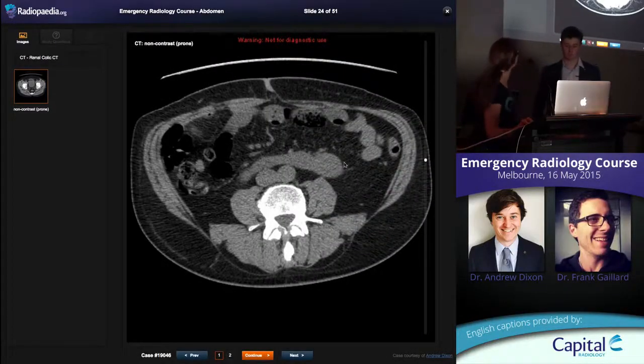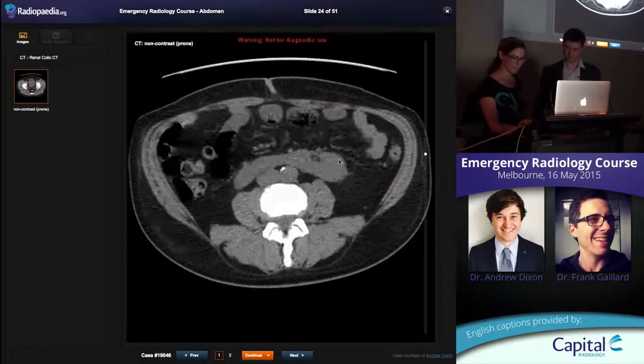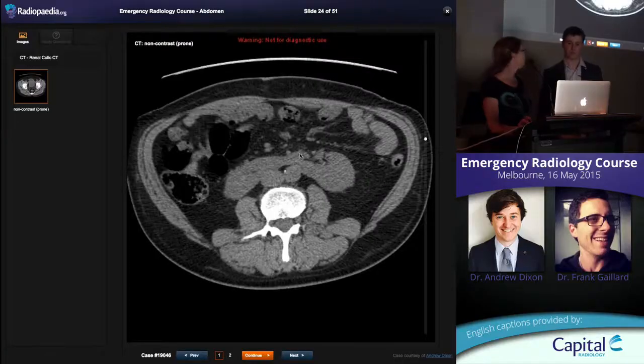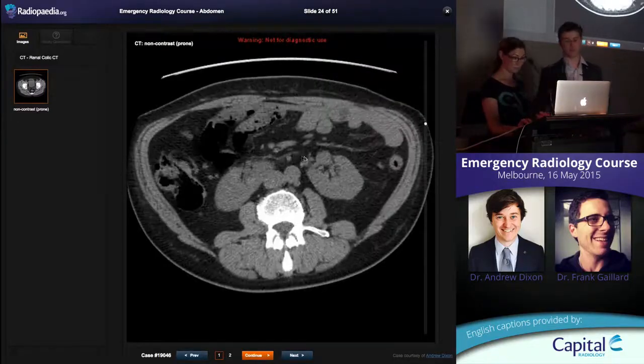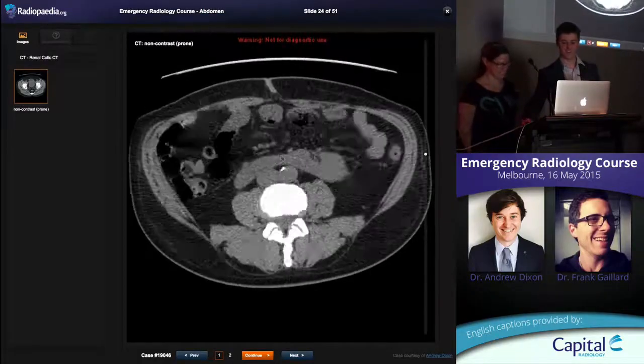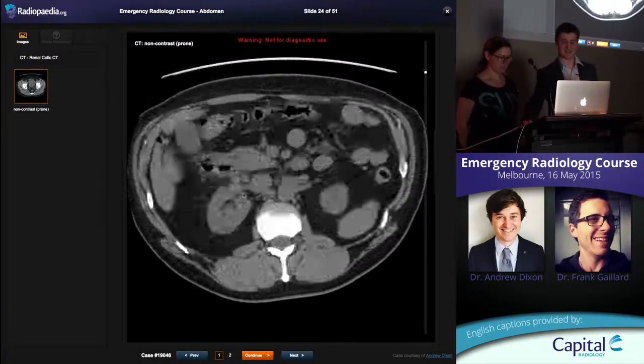This was the duplex one. I think, yeah, the horseshoe. Horseshoe shaped. Yes, sorry. So yes, they're obviously joined. The lower pole of these kidneys is joining across the midline. So a horseshoe. Yeah, you want to do an ultrasound. I want to do an ultrasound.